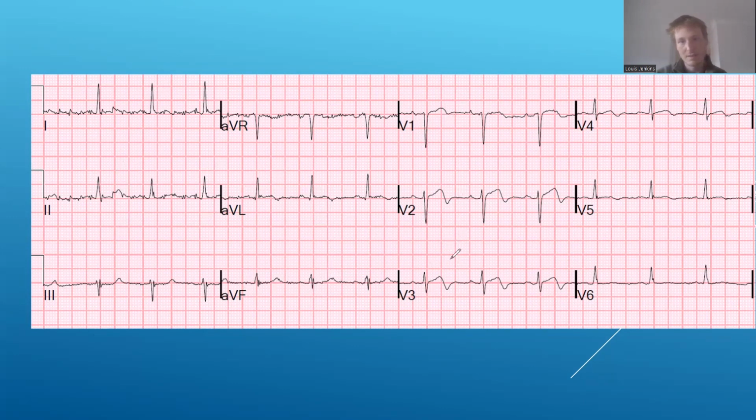And then we're going to look at our precordial leads, and that's when we do notice that we have these biphasic T waves. And I hope you know what I mean by biphasic. Basically, it just means that the T wave is going in one direction and then it's going in the other direction. That is biphasic. Bi means two, and phasic, I guess, just means phases, I assume.